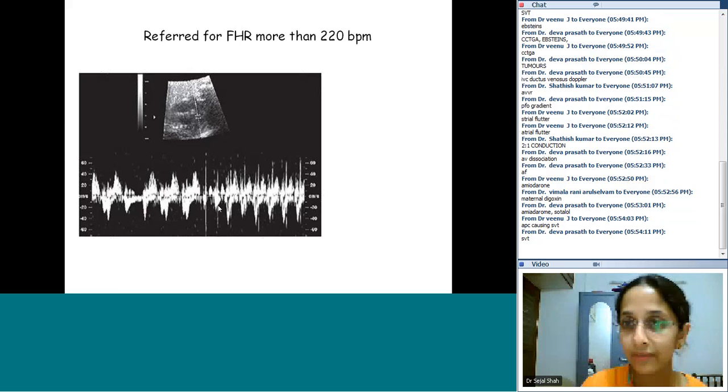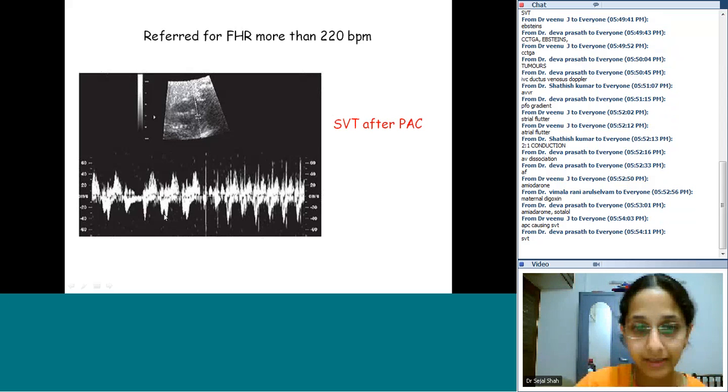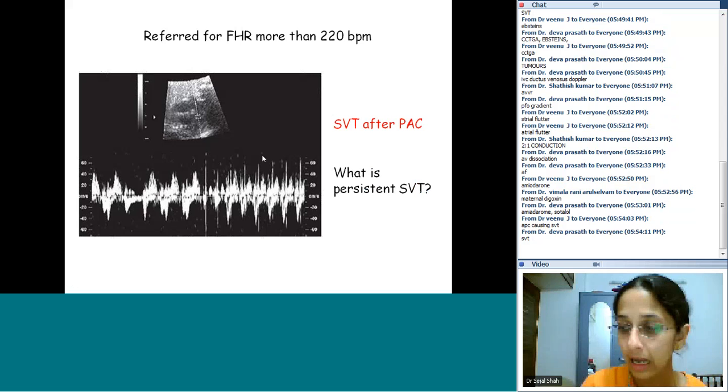Now in this it has happened in front of us, but in general when somebody gets referred with a heart rate of 220 beats per minute, how do we know that it's going to be persistent? Does it matter? SVT can be temporary, can be persistent. So how do we define persistent SVT? This is important for us because there is a little debate about what to do when the SVT is transient. It doesn't remain for a longer time. For persistent SVT there is a standard guideline for management.